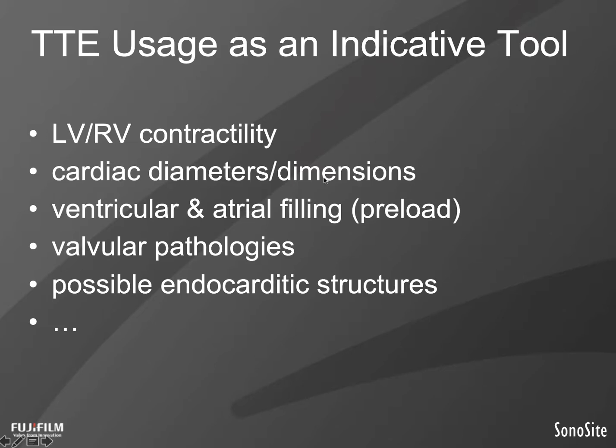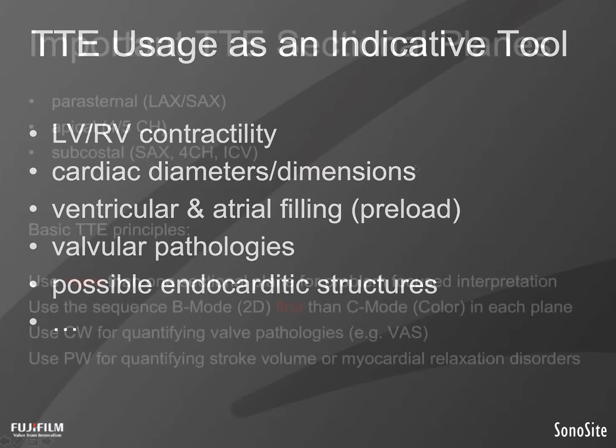Then we continue to evaluate overall valves. In particular, we search for valvular pathologies, for example, stenosis, insufficiency, as well as endocarditic structures. And finally, if you're getting more and more experience in TTE, you will exhibit more and more interesting findings which are relevant to understand hemodynamics in each patient.